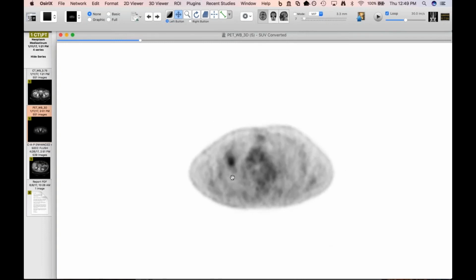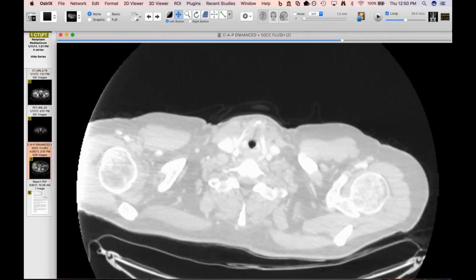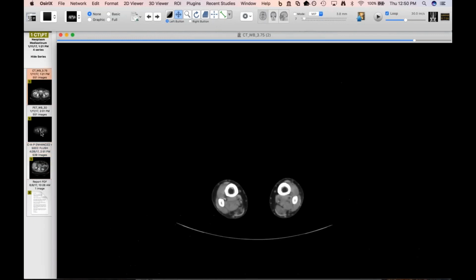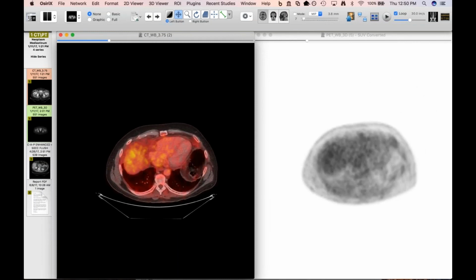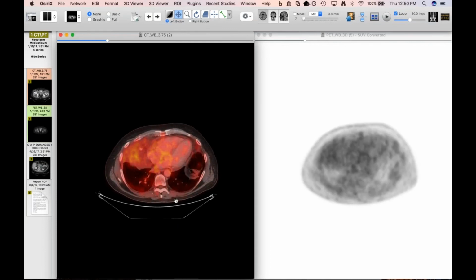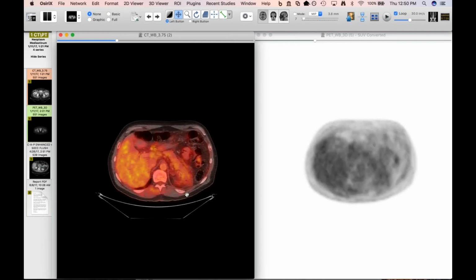And there's a little bit of activity. Yeah, I wouldn't have guessed that. So was that big anterior cardiophrenic angle mass lighting up on the PET? Yeah, it was. Here, I'll put up the PET side by side with its CT correlate. It has some low level metabolic activity in it, right in here. I mean, it's not lighting up. It's not even really much bigger than baseline. But the stuff in the retroperitoneum is similar too.